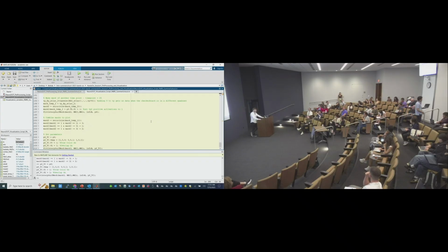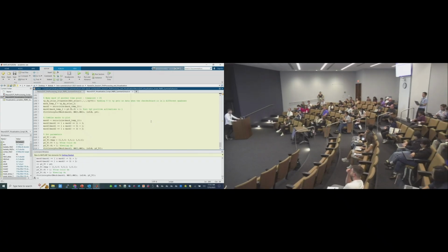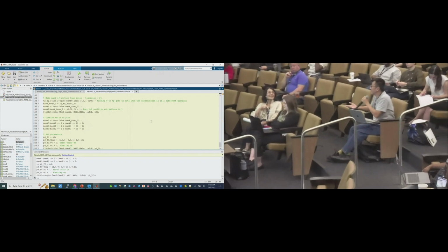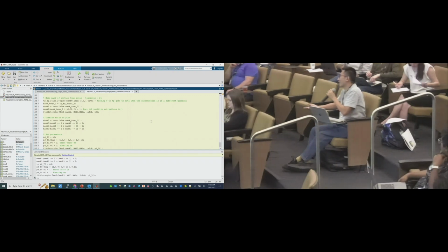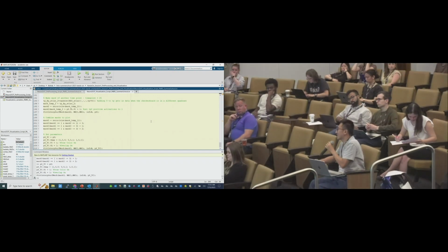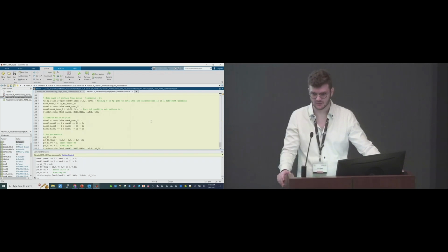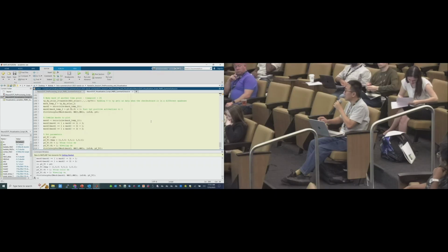Sorry, the data you already prepared for us, the DOT mat data, I can load it now, but my data is not in that format, and I don't know how to transfer it into this. That totally makes sense. What format is your data in, if you don't mind me asking? Is it in like an SNIRF structure or a NIRS structure? Yeah, it's NIfTI.